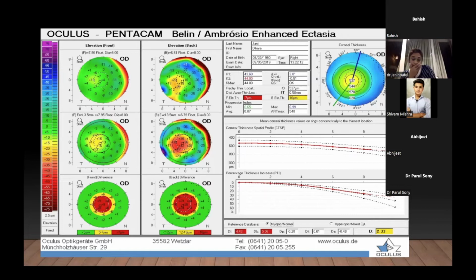Yeah. So in this case, if we are looking at the back element, it's in yellow. The front element is in red, right? Which one? In this same slide. Which back element? Here, this one. And the progression index is in green, like 0.65. Where? Are we on the same slide? Yes. Oh, okay, you're talking of the numeric. Yeah, so the front is in red.